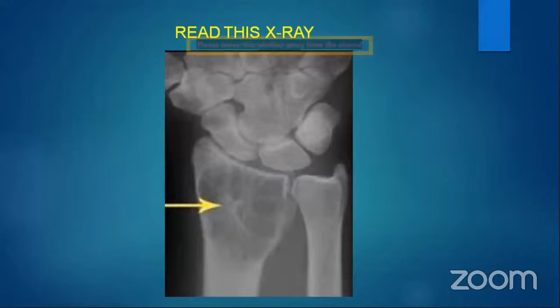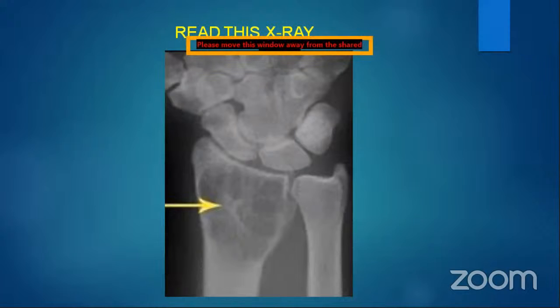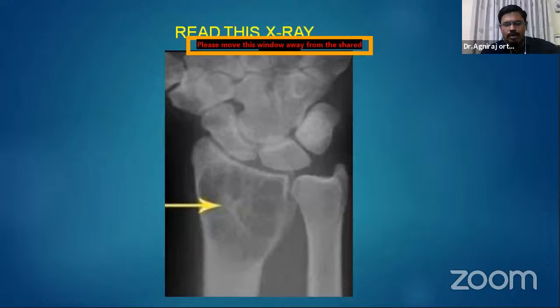Now I invite anyone, can I call Suresh Lakshmikantan to read this X-ray? Yes, Suresh, you can unmute yourself and read this X-ray. First I instruct you, don't give a flash diagnosis. We don't want the diagnosis. You first read the X-ray. Based on that, we can arrive at a diagnosis.